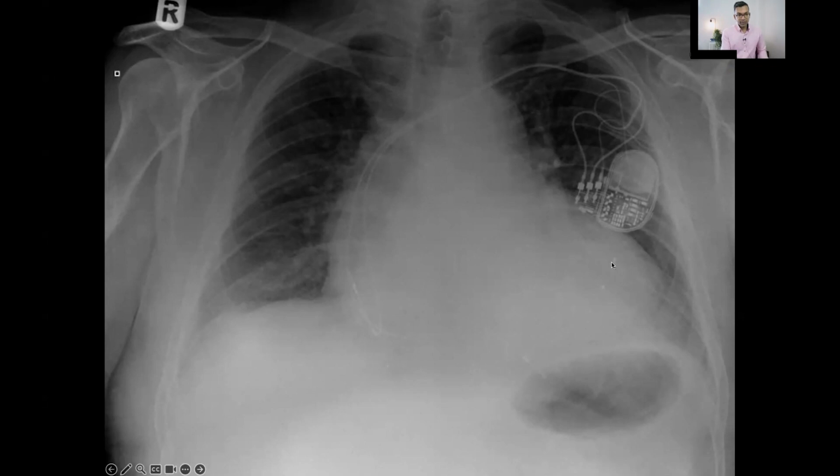And then if you look at the pacemaker box, there's 1, 2, 3 leads that plug into the box, where those connections are. I can see 1, 2, 3 little spots there, which led me to think that we've definitely got atrial and ventricular pacing. Yeah, and it's safe to say with biventricular pacers, it's fine that it has a third lead there as well.